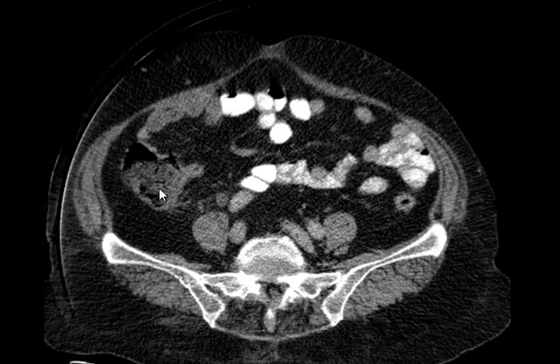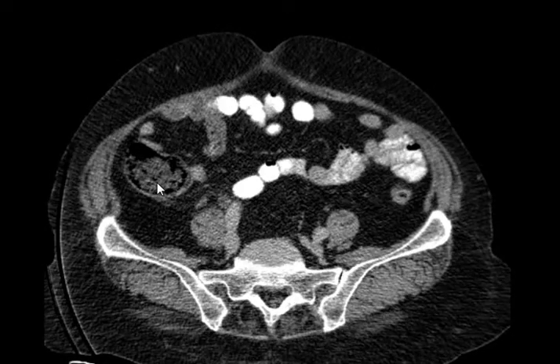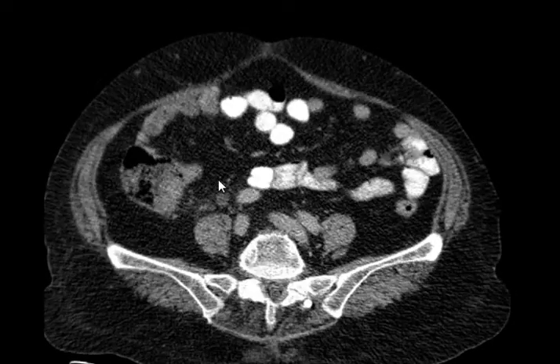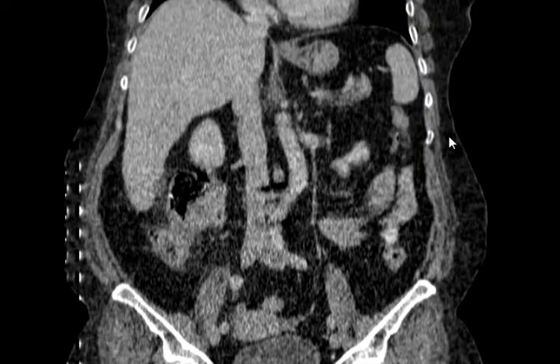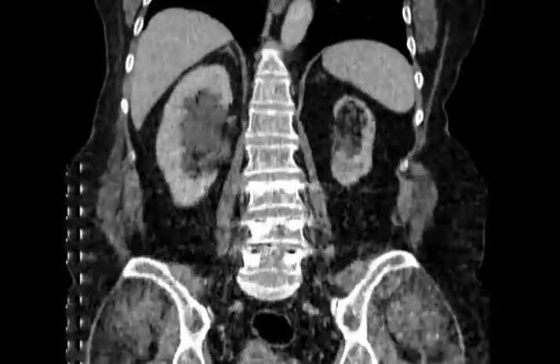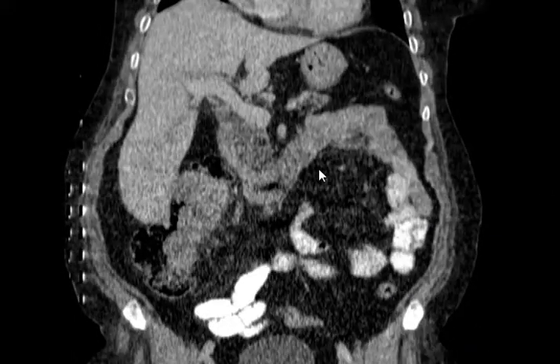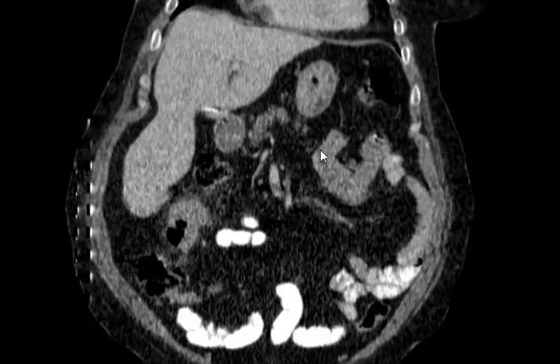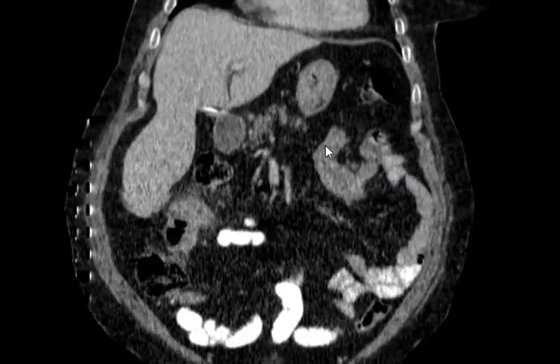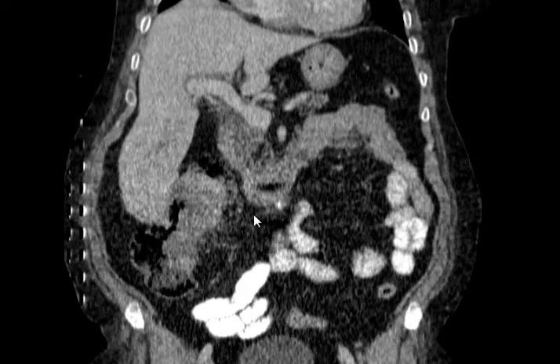How do you know this is not fecal material? It is ill defined, has gases within the lumen, soft surrounding colon, no thickening, no nothing. So it's most likely fecal material. Let's go to the coronal. Maybe this one. Going down. So what's going on? And again, there are two things the radiologist missed: the very small and the very large.